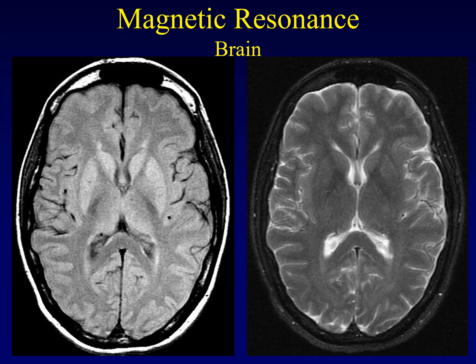We like to talk in terms of T1 and T2 weighted sequences, and sometimes you'll see oversimplifications like on T1 the CSF is dark and on T2 the CSF is bright. But those axioms are so simplistic and MRI has become so complex that the axioms are essentially worthless. I am showing you two different pulse sequences that demonstrate the same anatomy here. This one happens to be a proton density sequence, and this one a T2 weighted sequence. And in fact, the CSF is bright on a T2 weighted sequence. And they show different aspects of the anatomy.